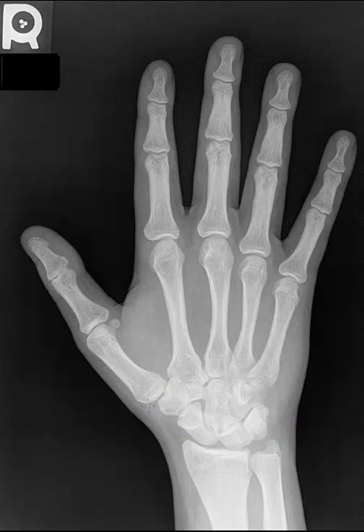Moving on, these articulations are the carpo-metacarpal joints. They are between the carpals, which we just discussed, and the metacarpals. Now, the common joint between them, again, is called the carpo-metacarpal joint. Now the metacarpals, there are 5, have 3 distinct areas that we like to discuss. The base, which is in the region of the carpal metacarpal joint.